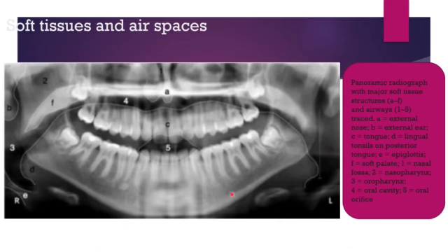Along with the bony landmarks, you can see the soft tissue shadows in the air spaces. Marking A reflects the external nose and B reflects external ear. C indicates the tongue image and then D indicates the lingual tonsil on the posterior tongue and then E reflects the epiglottis. So that you will see here. And F reflects the soft palate. You can see here F reflects the soft palate.